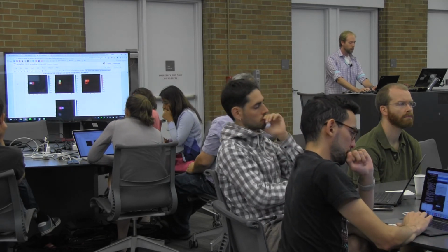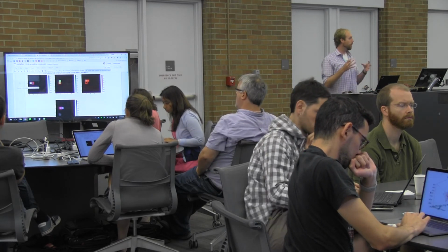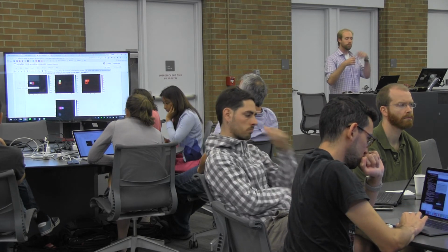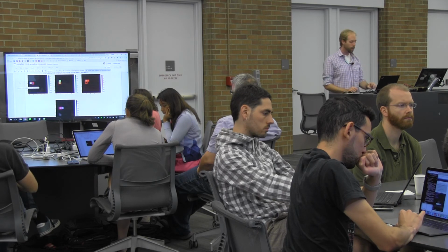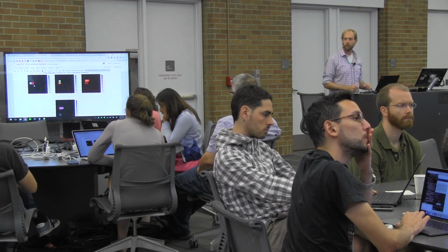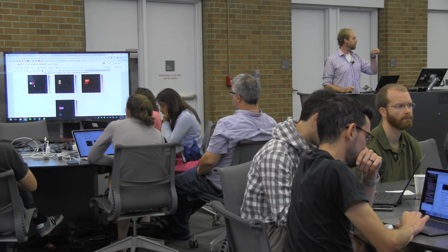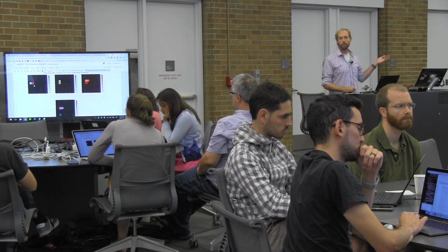So what I'm showing here is the receptive field for all of the voxels that we've highlighted. In this case, the relative position of these plots corresponds to the relative position that the voxels have to one another. And higher values or more colored values mean that pixels that are in those locations tended to be correlated with increases in the voxel activity for that voxel.